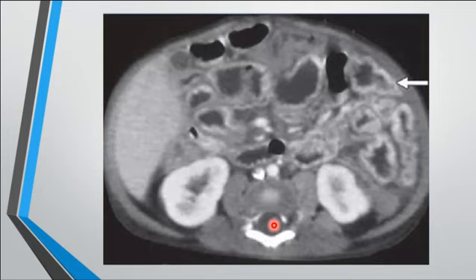Mesenteric ischemia is a possibility. However, there is no pneumatosis intestinalis, and there is no hypoperfusion in case of trauma. I told you there is no trauma, there is no blood loss. It's a good differential if there was a history of trauma, but there is no trauma.